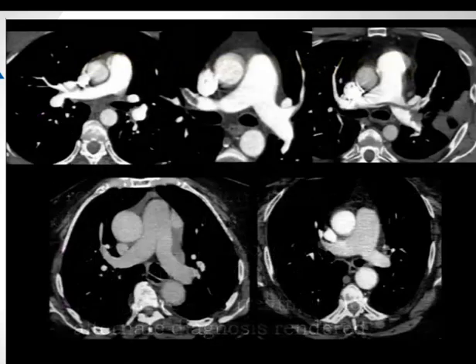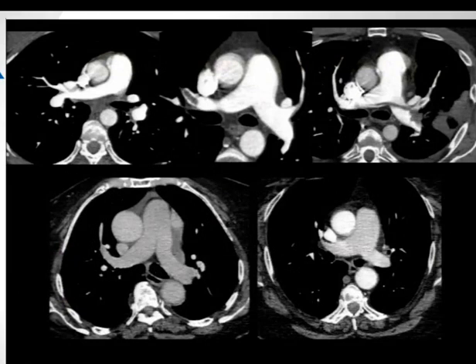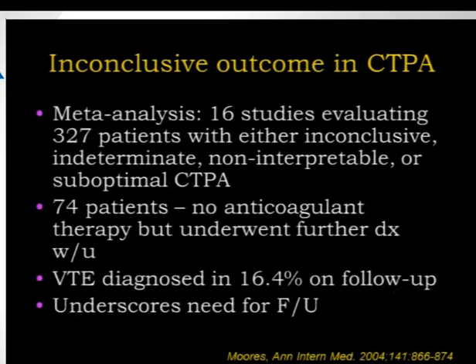However, if we say that the test is indeterminate, different things can happen. Some of our referring base will just assume it's negative, but others will proceed with something else. I have 5 images here for you, all different patients. Obviously, what you'd like to see is a good quality study, as the one listed above. One is negative and the others are obviously positive. However, when you have an indeterminate study, that is somewhat problematic. And so what do we do with those particular studies?